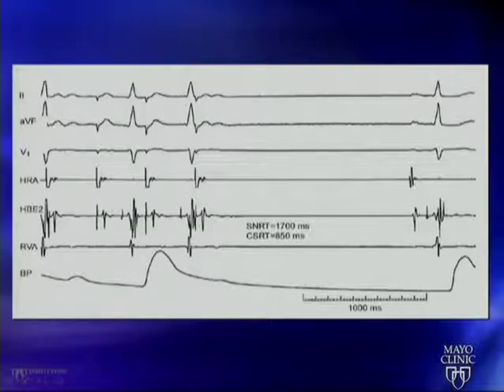It's taking too long to wake up. Everybody, if you pace the atrium and suddenly quit, or you have AFib and the AFib suddenly quits, it does take time for the sinus node to realize it's time to start beating again. But some folks with sinus node dysfunction, it takes too long.